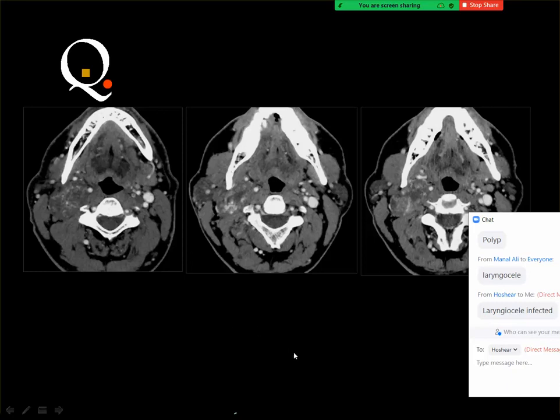And in order to know the diagnosis, you should locate the lesion in relation to the parapharyngeal fat. If it is lateral to the parapharyngeal fat, then you should mention part of the parotid gland. But if it is posterior to the fat, then you are in the differential diagnosis of glomus tumor, neurofibroma or schwannoma, and lymph nodes.